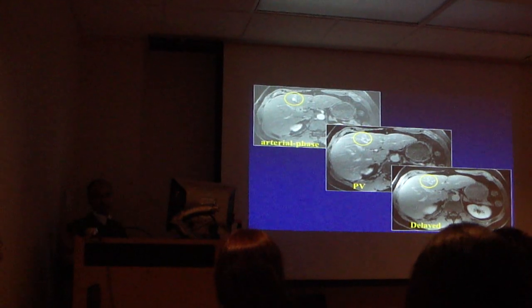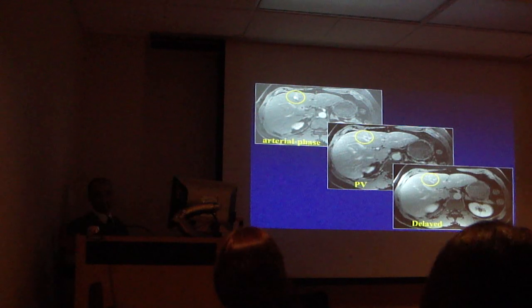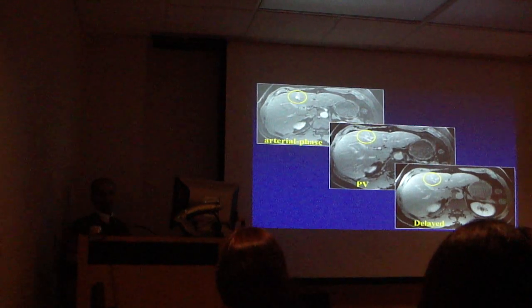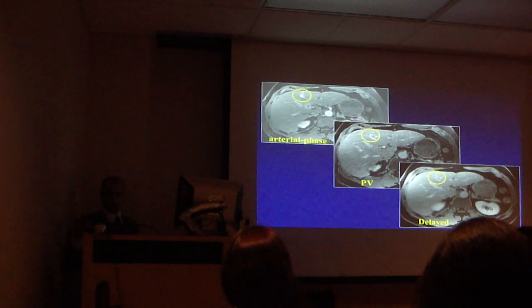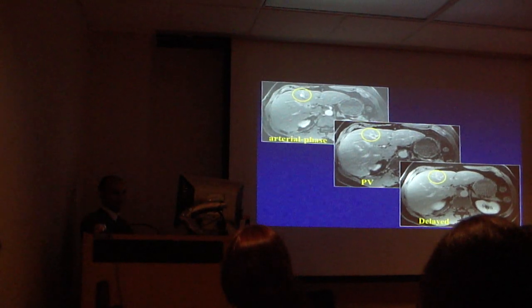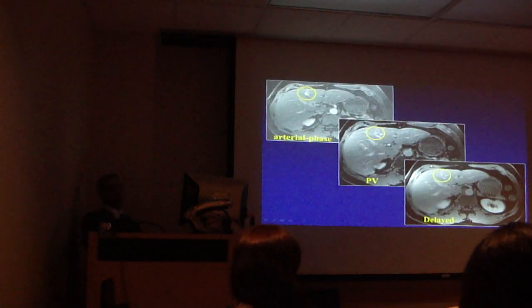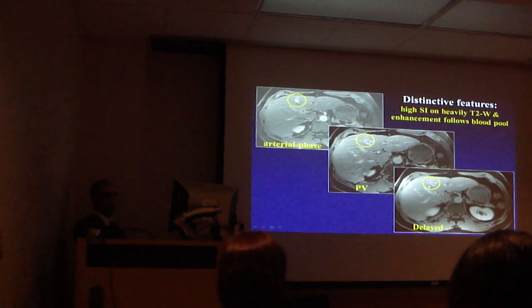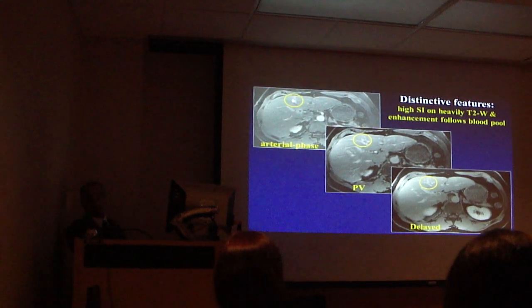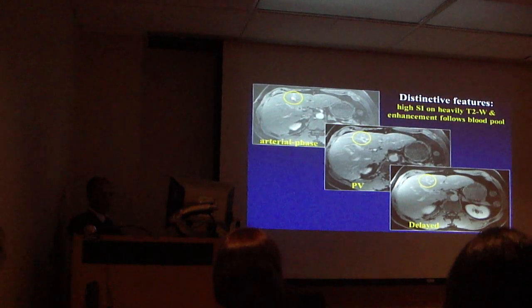That's all right. There's nothing wrong with being wrong. Is there washout? Yes or no? No. Exactly. So I said, between those two features, whichever is most worrisome is washout. Here the lesion enhances. Maybe you think it's not well circumscribed. To me, I thought it was. Maybe I was wrong, but it definitely does not demonstrate washout. It is still enhancing, correct? So it fulfills the criteria of a flash filling hemangioma. It enhances in the arterial phase and does not demonstrate washout.